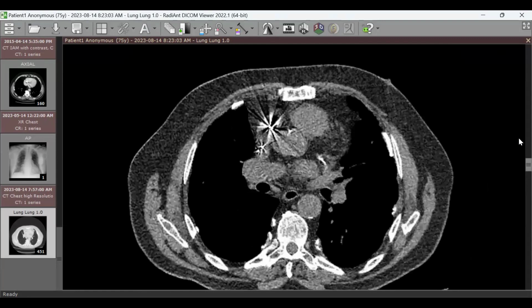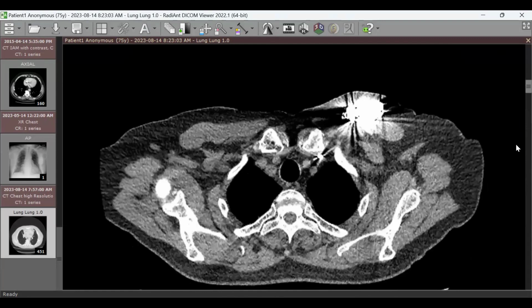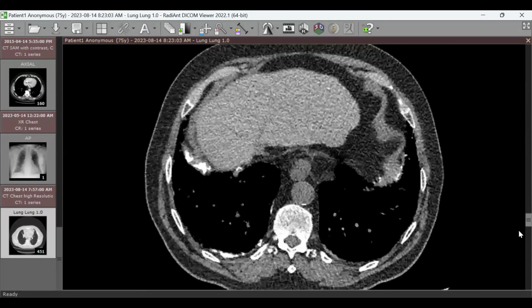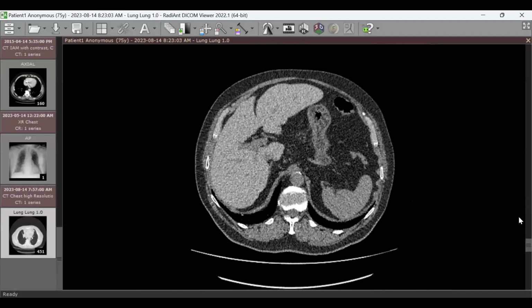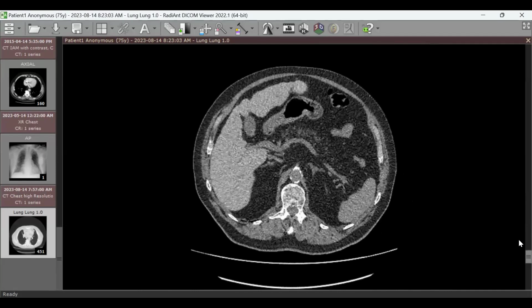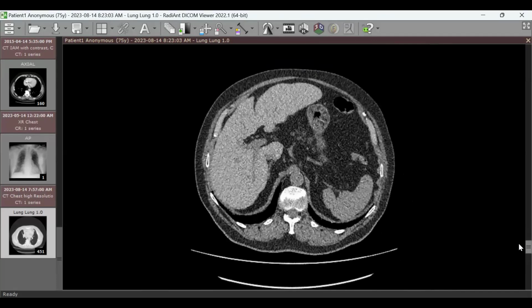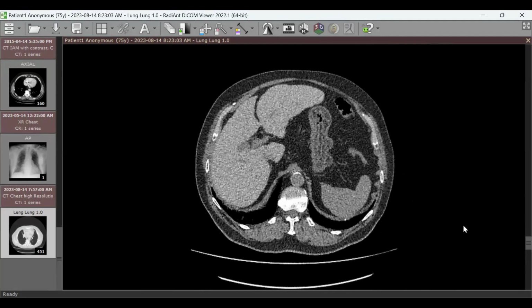I mean, just to make it simple, we need to look for other things, right? Yes. So if we have part of the abdomen visible, we need to have a look at the abdomen here. May have some sort of hepatic fibrosis, irregular outlines of the liver. That's one element. You're right. Irregular outline of the liver may have some sort of hepatic fibrosis or cirrhosis.